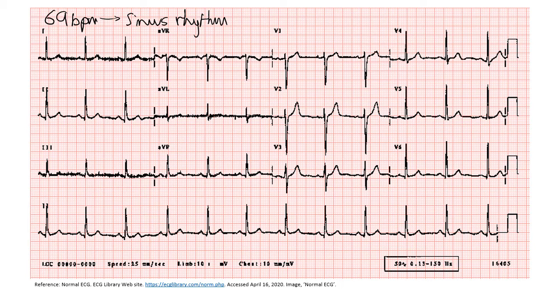So that's basically an indication of the very basic things that you might see in an ECG trace. One final thing that I want to talk about, and this will only come with experience and maybe a little advanced for basic ECG interpretation, is the presence of ST elevations in myocardial infarctions. Basically, when you're looking at an ECG and you see an ST elevation, it indicates that there is some damage to the myocardial wall.